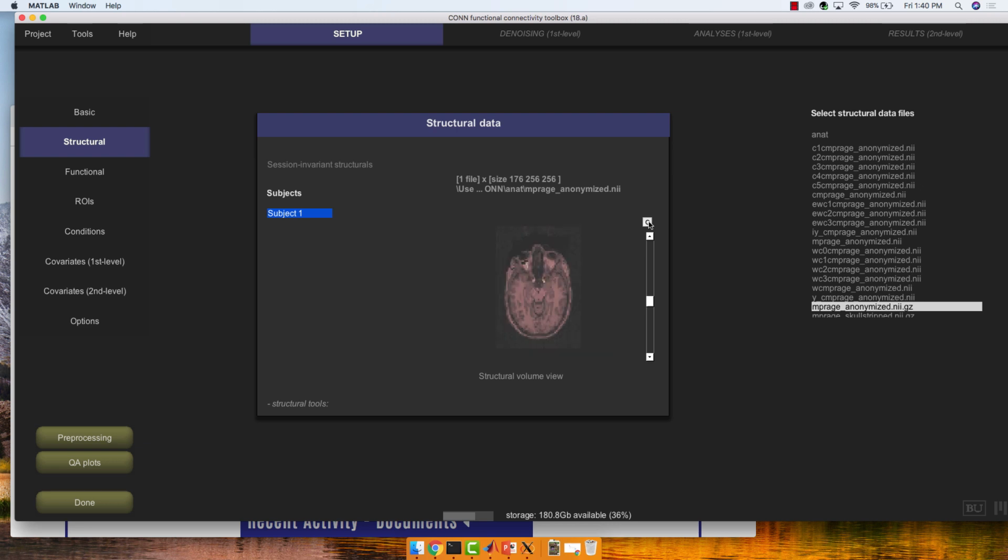Okay, are we all caught up? It's going to take a minute. I only unzipped the anatomical. Oh, I see. Are you okay if we move on? Yeah. All right.